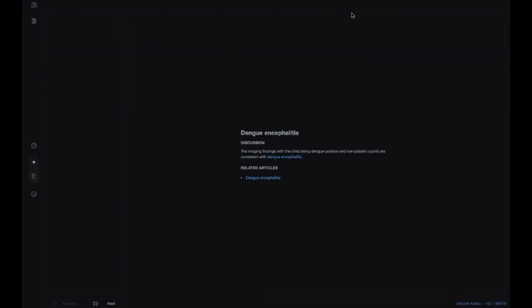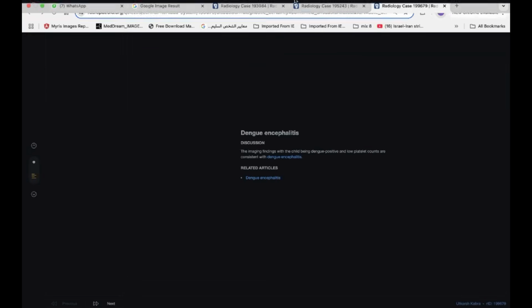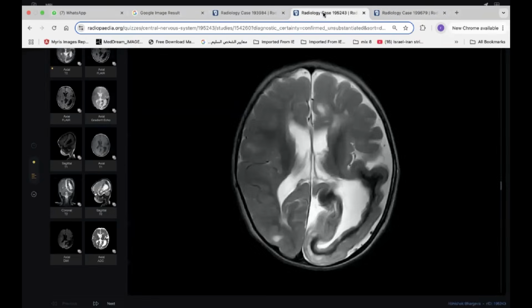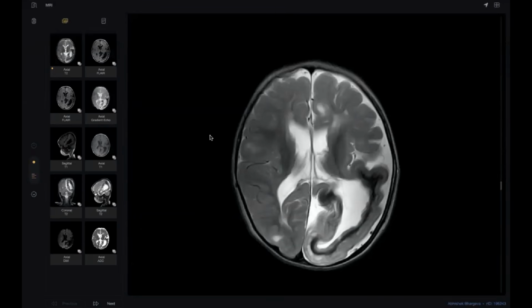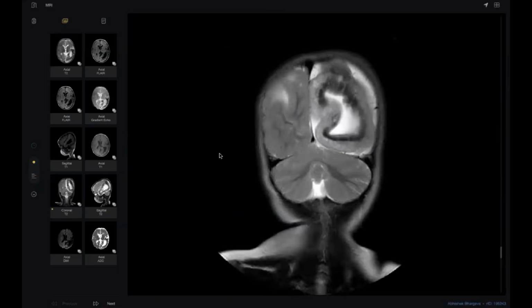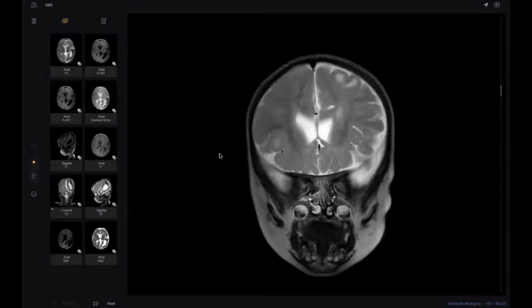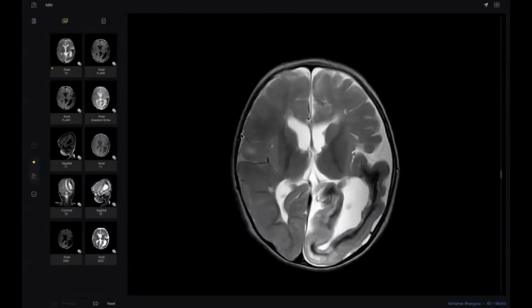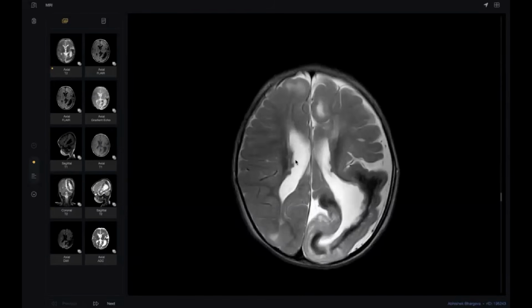Okay, somebody asked, is this case like the case before? Maybe Sturge-Weber, this one. I think due to the presence of this subependymal nodule, the diagnosis must be only tuberous sclerosis. The presence of these subependymal nodules closes the way in front of other differential diagnoses completely.